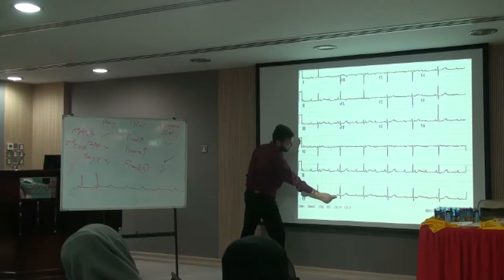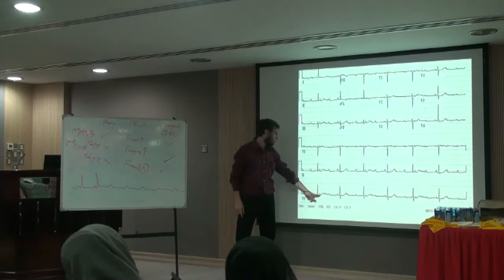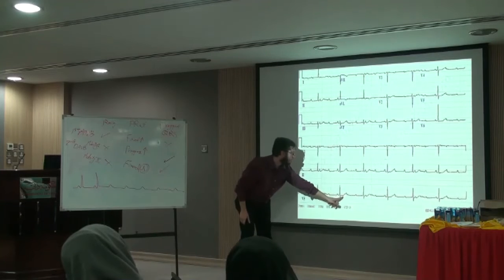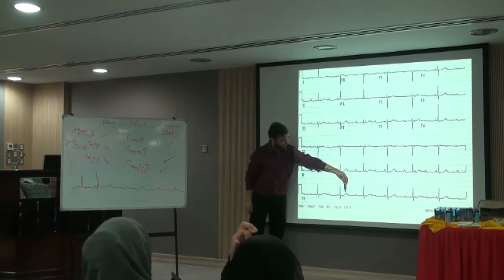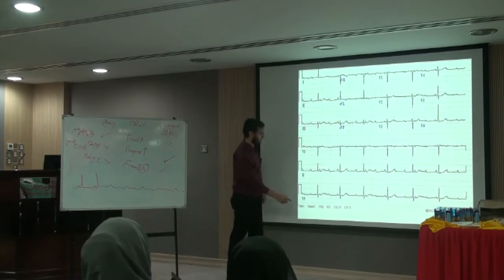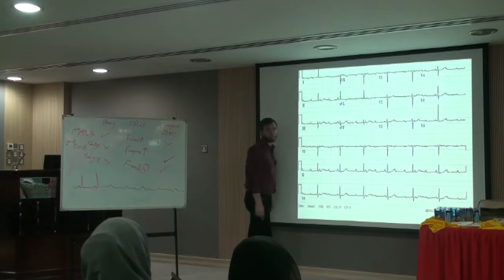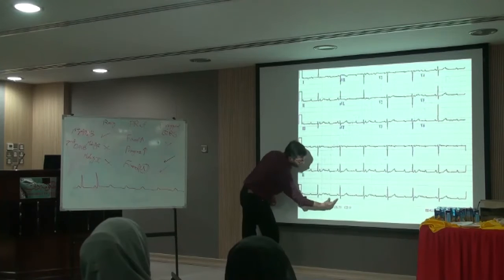Oh, and again there is another P here. See the shape of this T wave? It's actually a P. So here there's a different morphology of the T. So maybe there is a P on top of it. Okay. If not yet much convinced, these two P waves are very clear, yeah? So this is the PP interval.